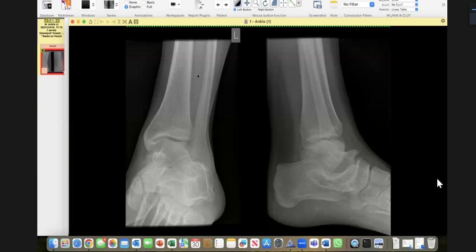Okay, thank you. So this was your first case. Now, your observation was fine, but the point is that a calcaneonavicular coalition cannot be visualized on a lateral view. It cannot be visualized on an AP view. The best view for calcaneonavicular coalition is an oblique view of the foot, and this is a viva question, and you have to ask for an oblique view. So this thing is the anterior process. You can say that it is very prominent. So where is the coalition? You will never ever pick it up.